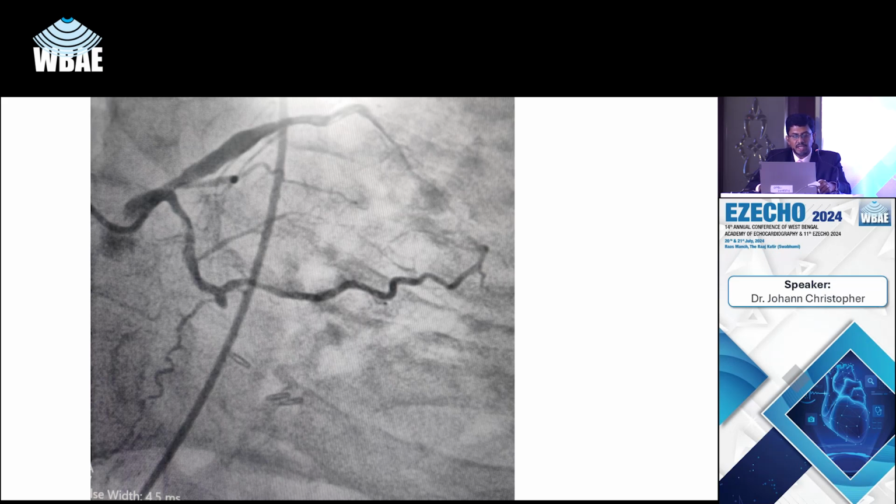So mass in the LA came for evaluation. On 2D echo it looked, could not differentiate it.